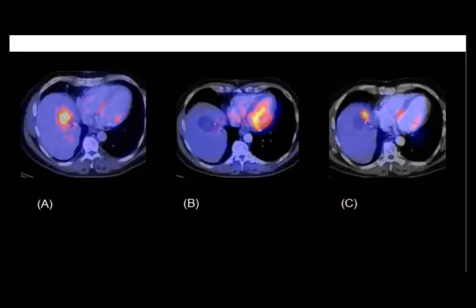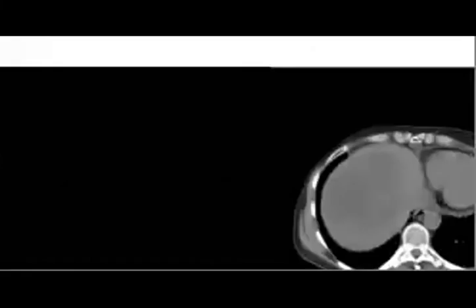And after he did a follow-up again, what happened here? There is increased uptake, recurrence nearby. Perfect, good. Yeah, recurrence. So this is what happened. I think it is an easy one. So I hope that you like the PET-CT images.